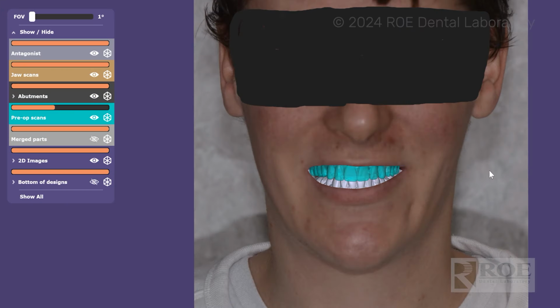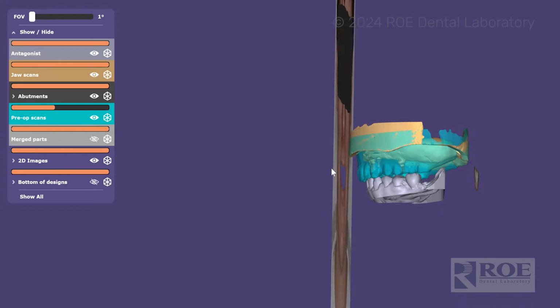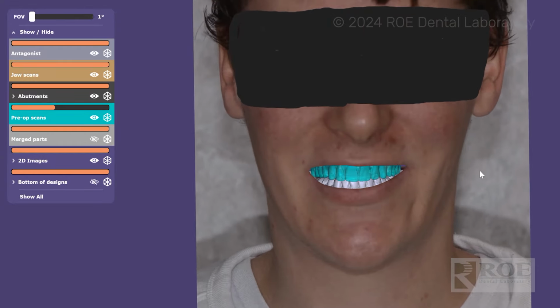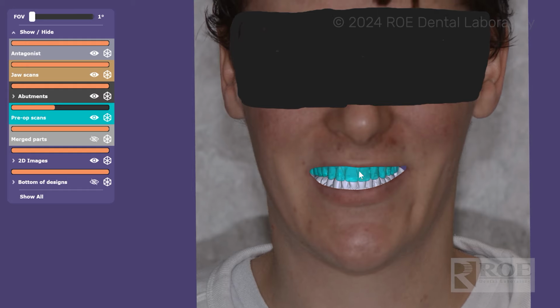This video is a quick tutorial on how to use our CaseCheck service. CaseCheck is a way for the doctor to verify that the restoration is being designed as requested. All right, so this video is just simply going to show how to use this viewer.